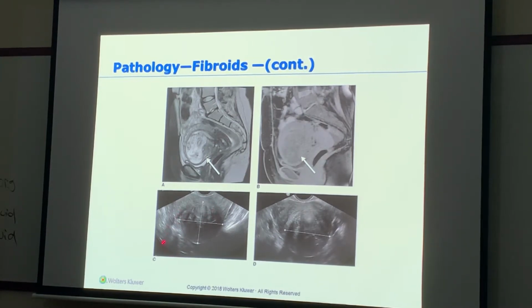See this coming down here, and you can see another one coming down here? Those are artifacts caused from ultrasound. Edge artifacts, I think is what they're called. Edge artifact. Okay? So, what is this artifact and this artifact? What is this? Let's just say, what is this artifact?